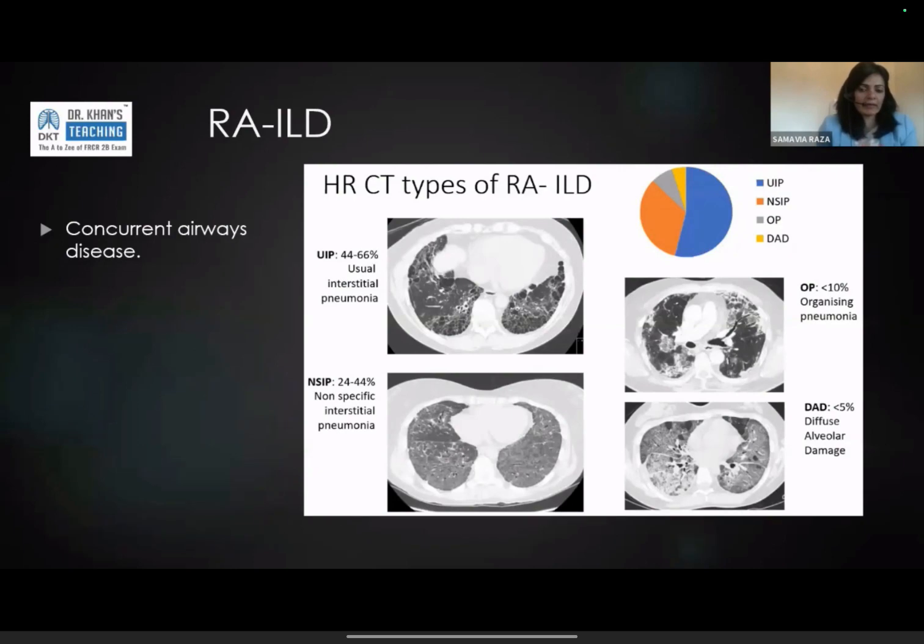And the ILD is almost never clean ILD. It's ILD as well as airways disease. So the airway disease they get is bronchiolitis. So the bronchi, the large airways, medium-sized airways have inflammation around them, so the airways can get thickened.